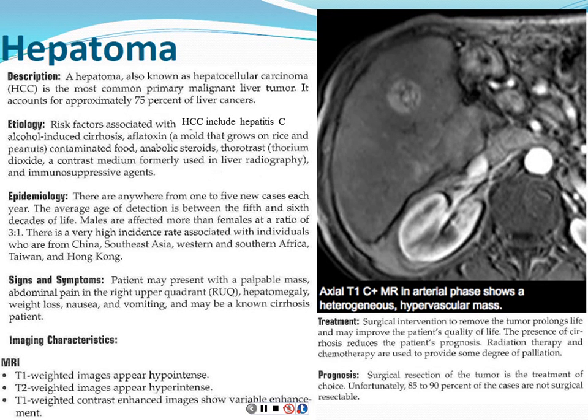The other important thing, like this says, this is in an arterial phase imaging. And in my experience, sometimes patients, I'm not sure if you've experienced this, when they receive contrast, and it's actually been shown as being a little more common with EOVIST, it causes them to feel transiently short of breath. And this arterial phase may end up having a lot of motion artifact in it, which makes it very difficult. We could see one like this, but if you were looking for a really tiny one like this, which is important to us, then you want to minimize motion artifact as much as possible.